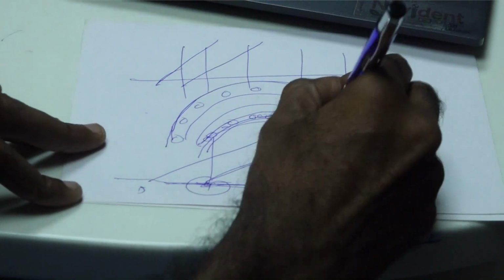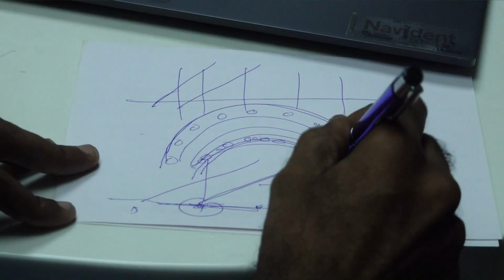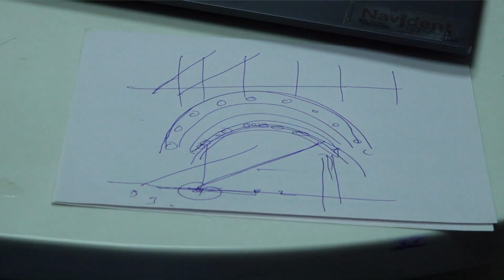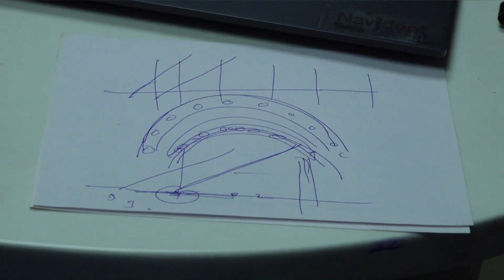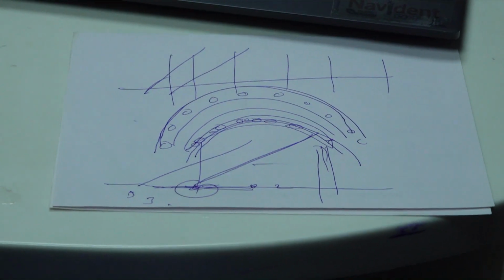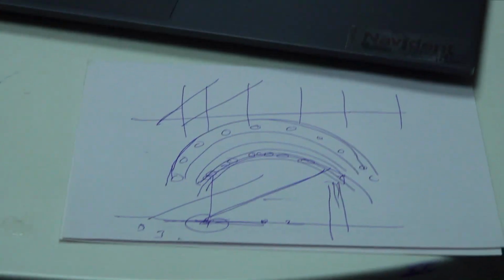If you put a tilted implant in 4, you cannot place a straight implant in 3 or 2. Only in the 1 area can you place a straight implant, and that too a short implant, as you cannot reach the nasal floor. So only 3 implants can be placed from 1-1 to 1-5. There are 5 teeth, but you cannot place 5 implants if you place tilted implants. Whenever you place tilted implants, the number of implants will become less.